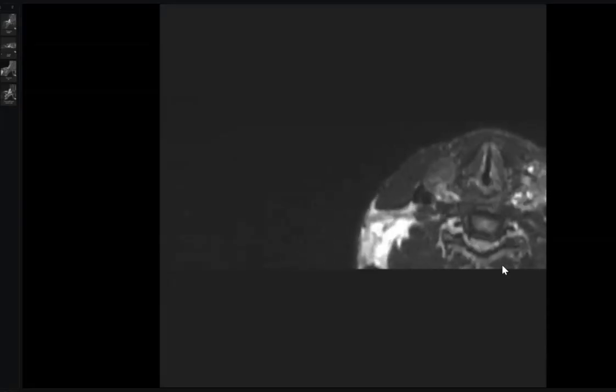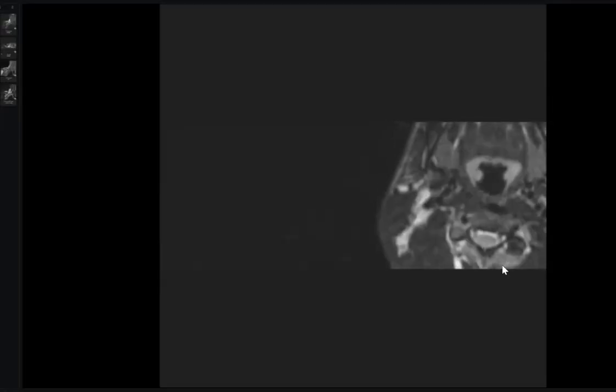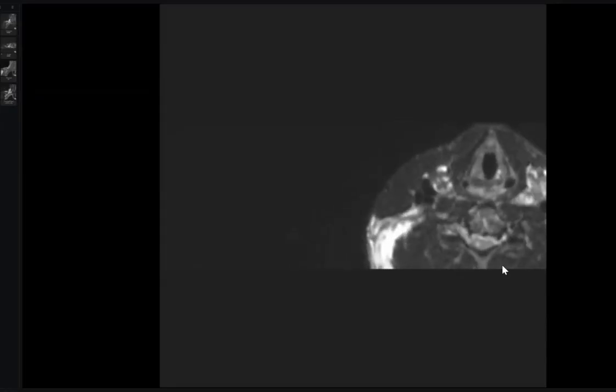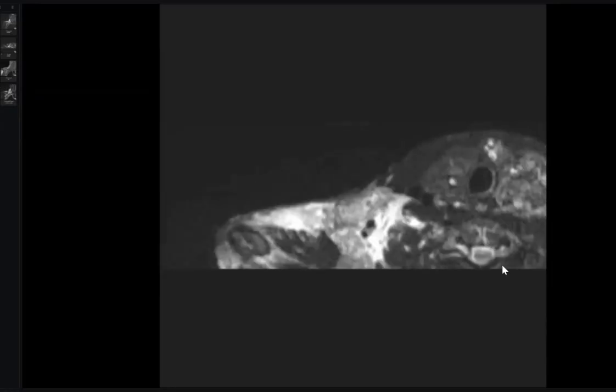At least I wanted to show one. Obvious. At least you can pick up a pseudomeningocele like this. We need more magnification, by the way. If you look here, this is more fluid and looks like a cyst or sac, whereas here this is the nerve, this is intact. But here, only fluid. This is a pseudomeningocele.